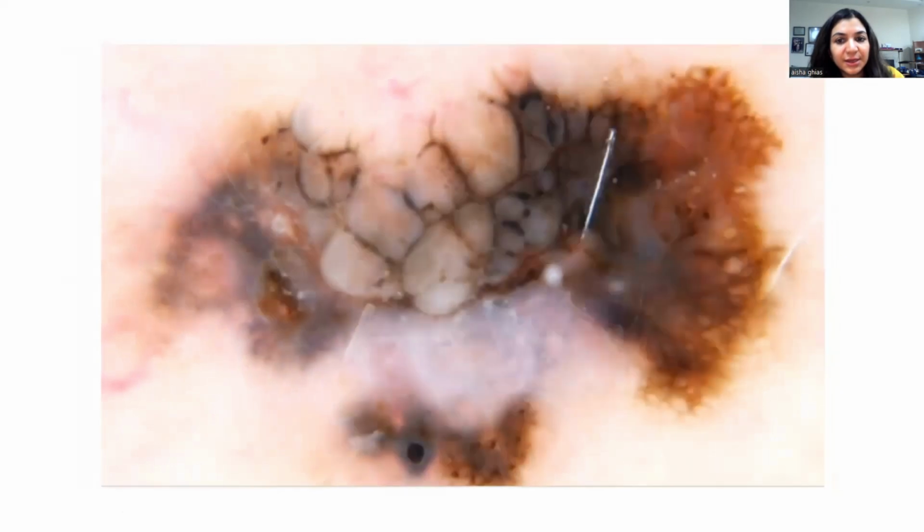Well, this was the last slide where we stopped in the last lecture, and this is a slide beautifully depicting the chaos. For example, there are so many things to see in this slide. These are the polygons, and similarly over here in the darker area, if you follow the cursor, these are different shapes, maybe closed shapes or partially open, and they've been lined by different lines having angles 90 degree or more. And these enclose partial or complete shapes of different sizes called the polygons. And polygons are a characteristic feature for melanoma.